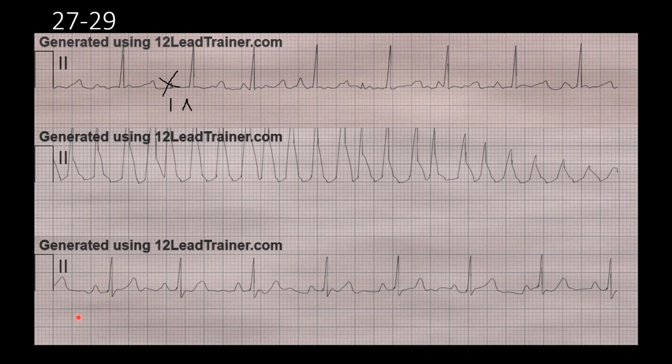So on the longer end, but still within normal. Our QRS is narrow and within the normal range at about 0.08. So with that information, we would call this a normal sinus rhythm. And there's just some artifact, which is what all these extra weird little wobbles are. It's not really anything significant, it's just artifact.